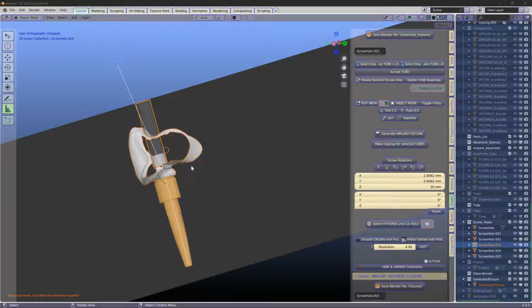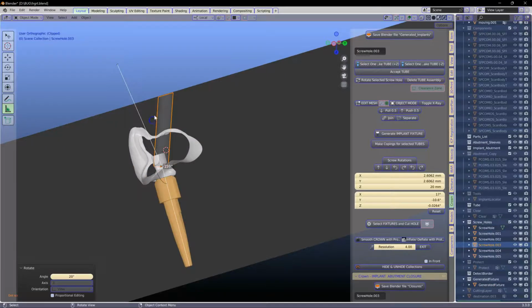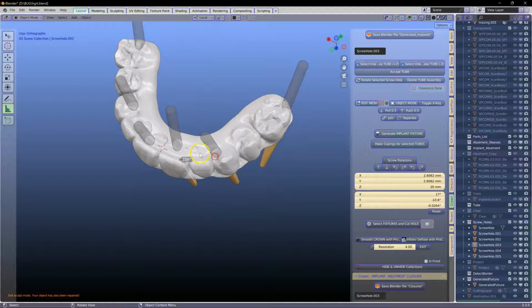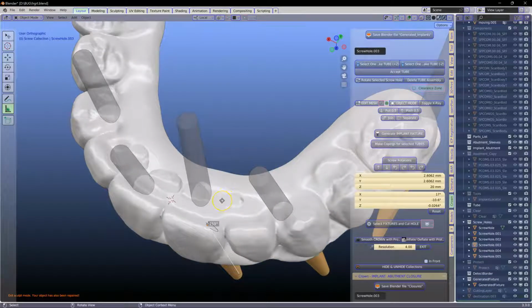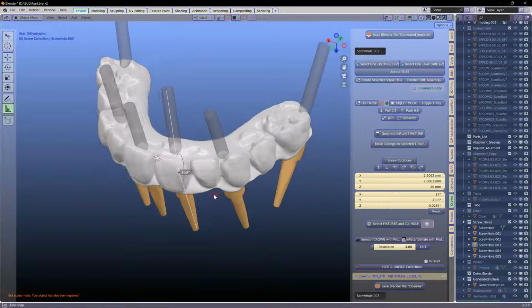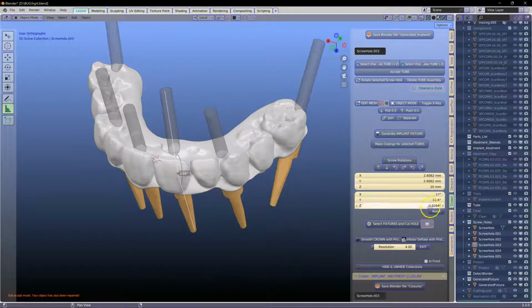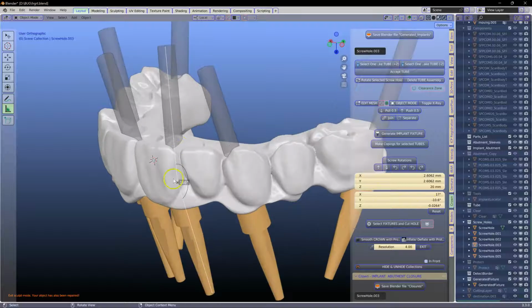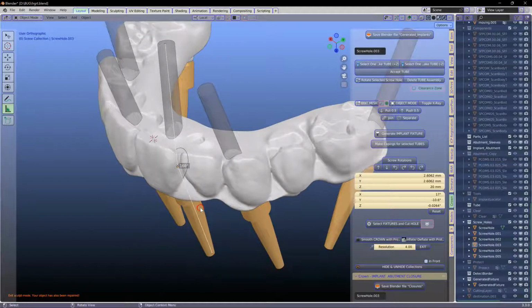So again, I'm going to go R20. Okay, so select, and then it's tilted it from my perspective, from my view, 20 degrees. Let us have a look and see if this is in fact true. Control like that, and we're looking at 160 degrees. And there's no 20 degrees over here. So this is probably the best way to analyze it and get your angles correct. Okay, bye.